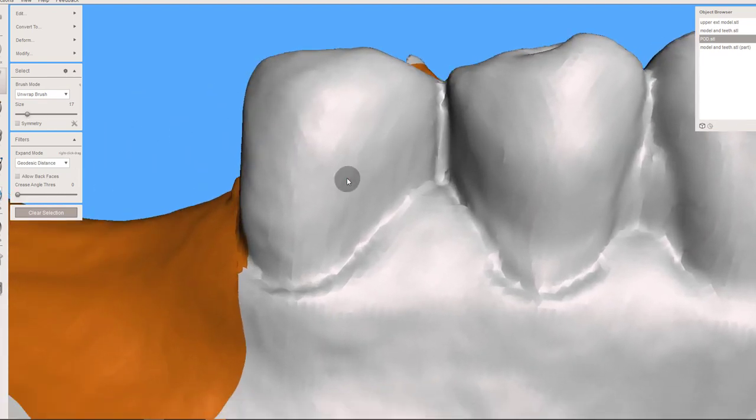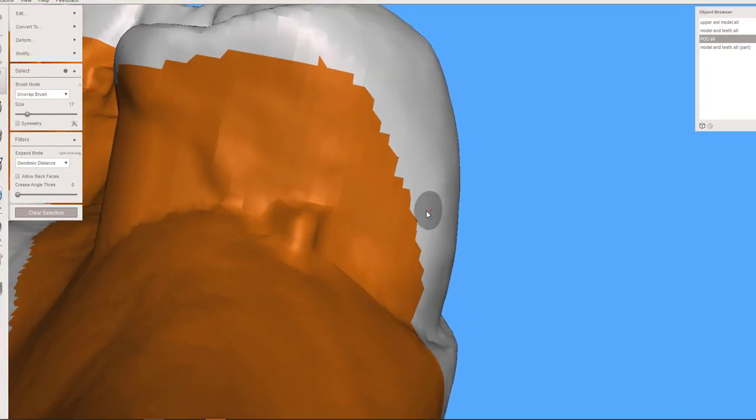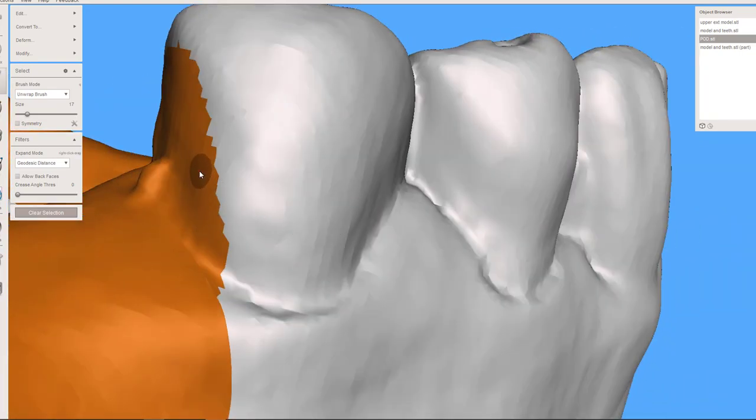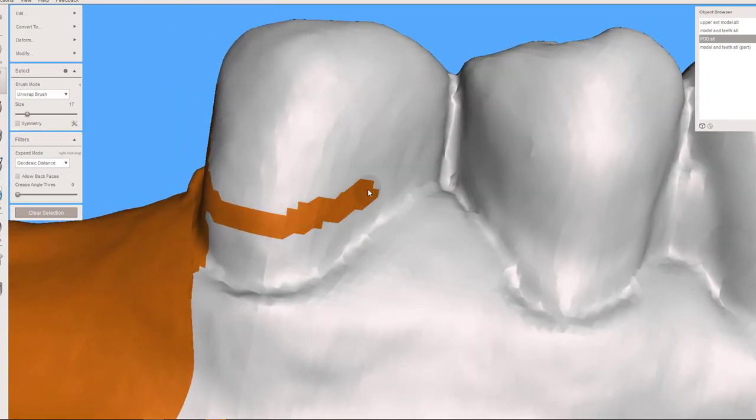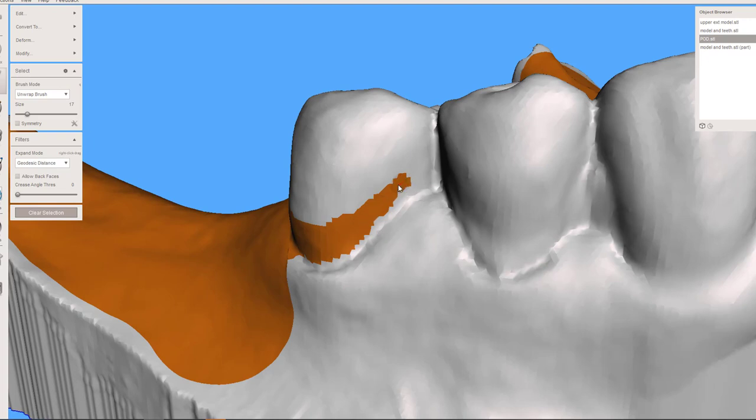So here, to create some clasps, I'm going to drop into these undercut areas a bit more. So remember, you can put these wherever you would like. So I'm going to try to follow closer to the gums with these. And maybe into that proximal surface. And remember, I am engaging undercuts, but only up to 0.3. So if there's an undercut that's beyond that, it's just going to get blocked out. So I'm not worried about that since we took the time to create that path of draw model in the denture module. All right, do whatever kind of clasp design you want here.